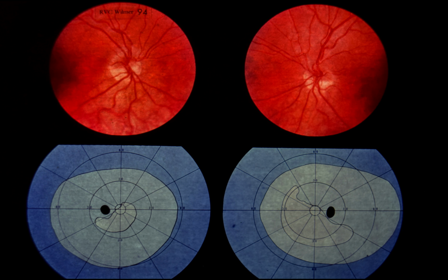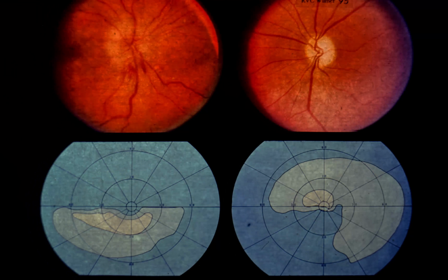Although the patient's visual fields show bitemporal defects, the defects do not obey the vertical midline as would the defects in a true chiasmal syndrome. No further studies are needed in this asymptomatic patient with a bilateral optic disc anomaly. Slide 95, Quiz 2. This patient has bilateral anterior ischemic optic neuropathy.